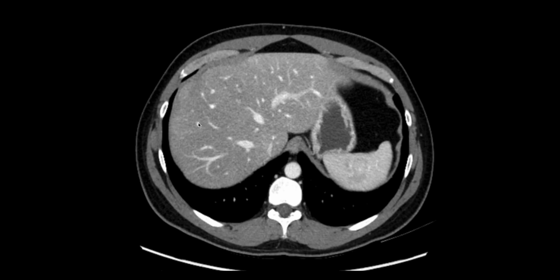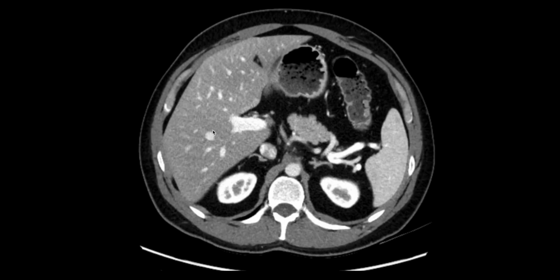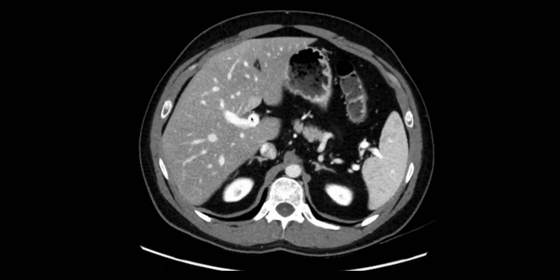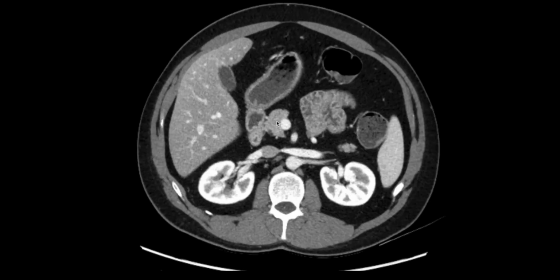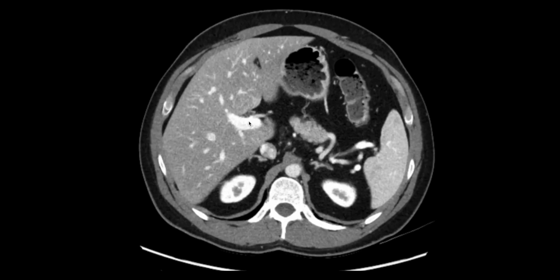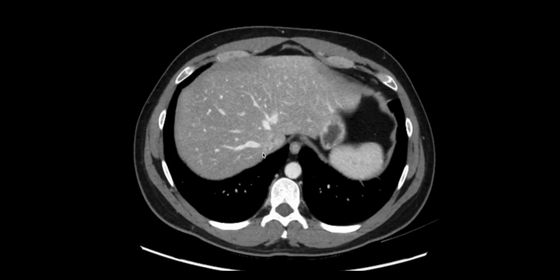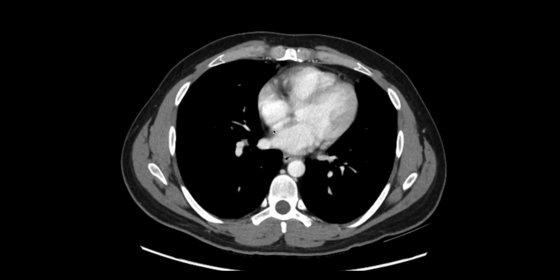When you're evaluating the liver, you'll want to think of a bit of a checklist, first starting with the liver parenchyma to look for any abnormal masses. Then, look at the gallbladder, intrahepatic ducts, and biliary tree, following the common bile duct down through the pancreas head, and finally the liver vasculature with the portal vein, intrahepatic branches, and also the hepatic vein and its confluence near the inferior cavoatrial junction heading towards the right atrium.